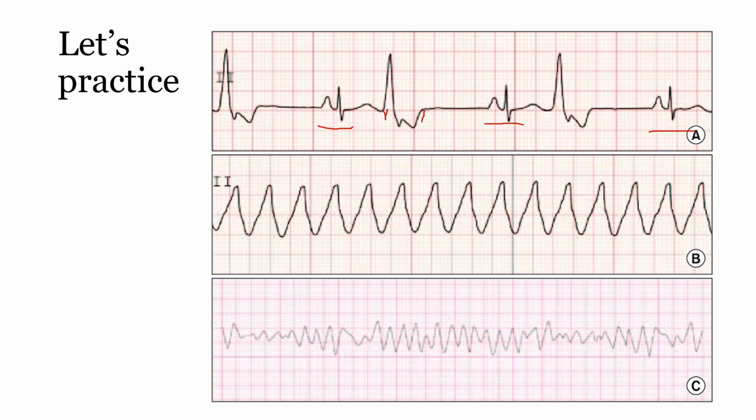Our patient, if they had a pulse, is it between 60 to 100? Again, assessing our patient, we may need to supplement with oxygen, but if our patient is not having good cardiac output, then we would initiate CPR. So check our patient, do they have a pulse? If they're in VTAC here, they're definitely going to have some problems with cardiac output. This is not going to be a patient who's going to look at you and say, I feel okay. Let's go to the bottom.